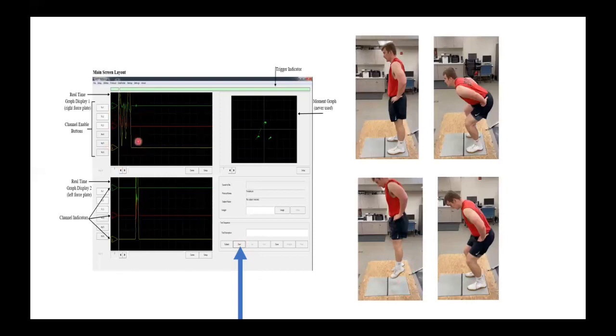And it will look like this if you do have the data on the screen when you stop it. Okay, but if this runs off, then you would have a problem just because you wouldn't have any data to interpret.